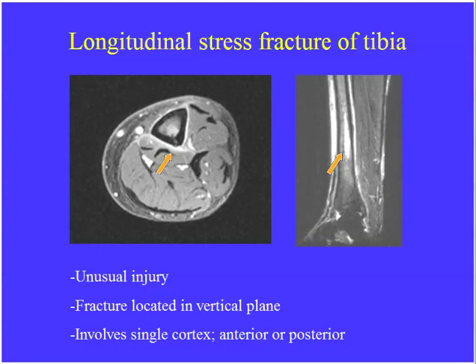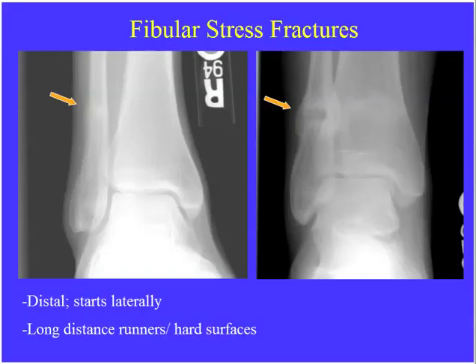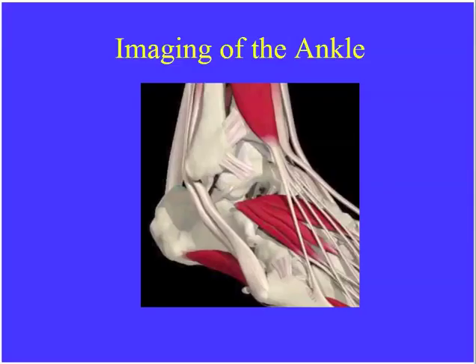We can also see the same appearance in the distal fibula. When these occur in the fibula, it's typically people who run on hard surfaces or banked surfaces who can get these stress fractures of the distal fibula.